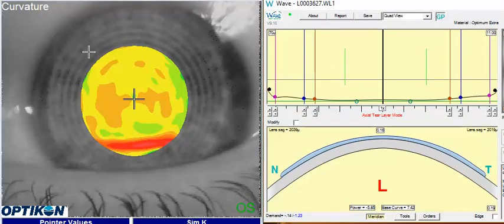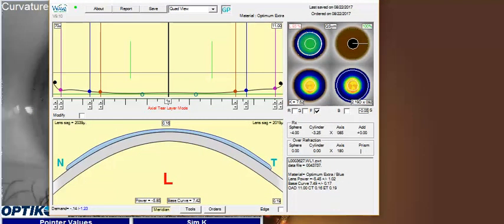So if you look at your topography here, because you have this little ridge down here, when you average out that corneal astigmatism, it's going to skew the shape factor for this meridian here, because it's going to average in this data into that overall meridian, and that way Wave is going to be designing off a topography that's now slightly not really accurate.